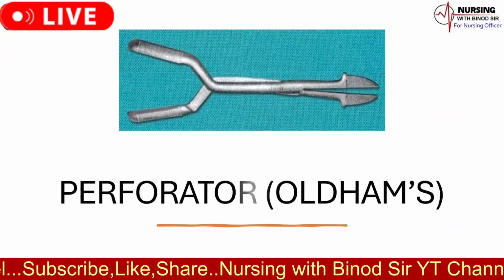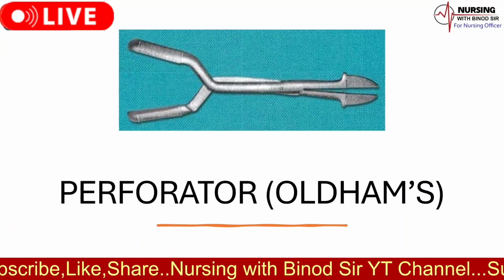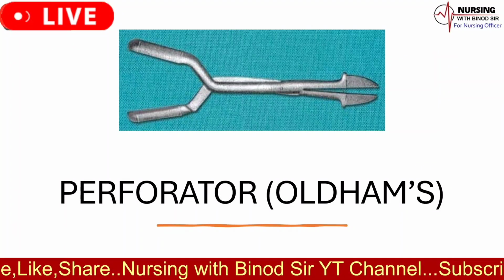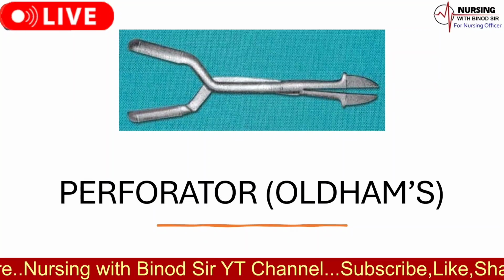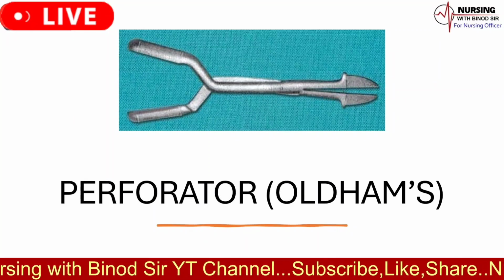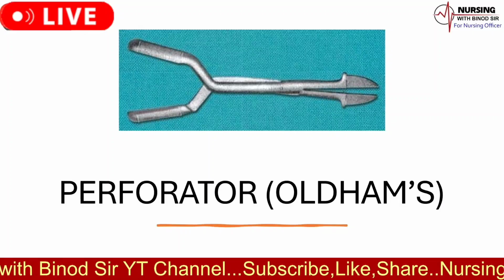The name of the instrument is perforator, Oldham's. The uses of perforator, Oldham's, is as follows. The instrument is required in craniotomy to perforate the skull bone for decompression of the fetal head.